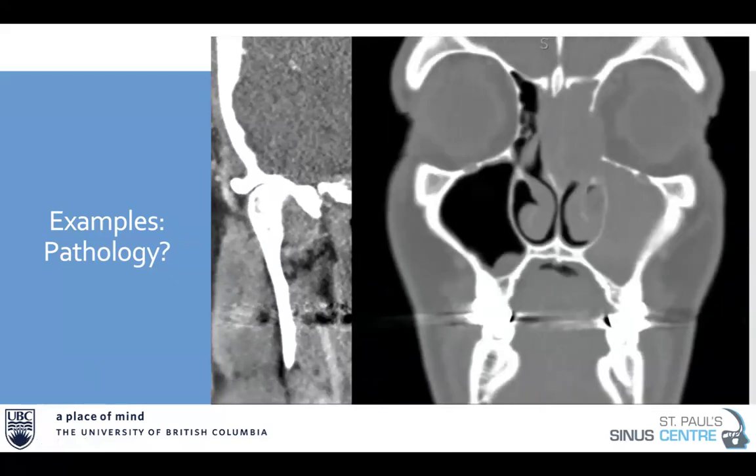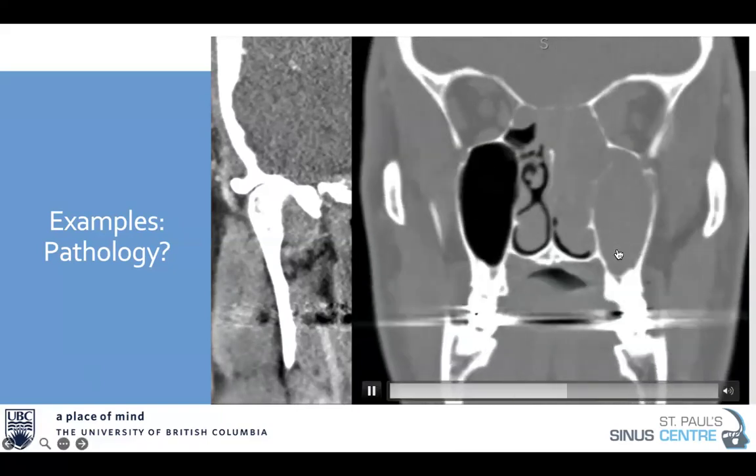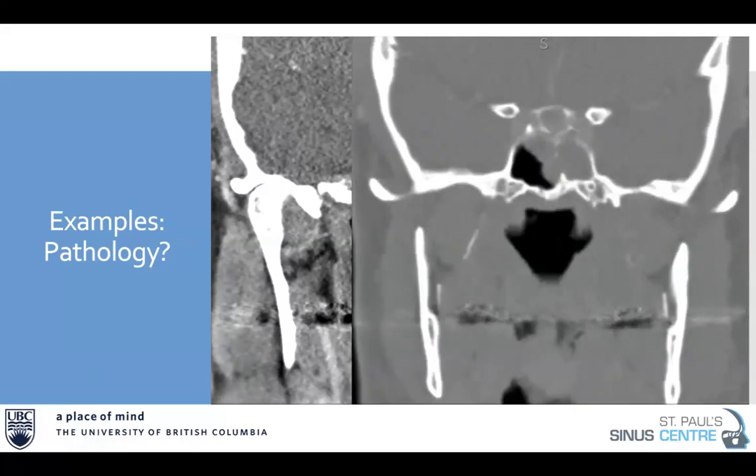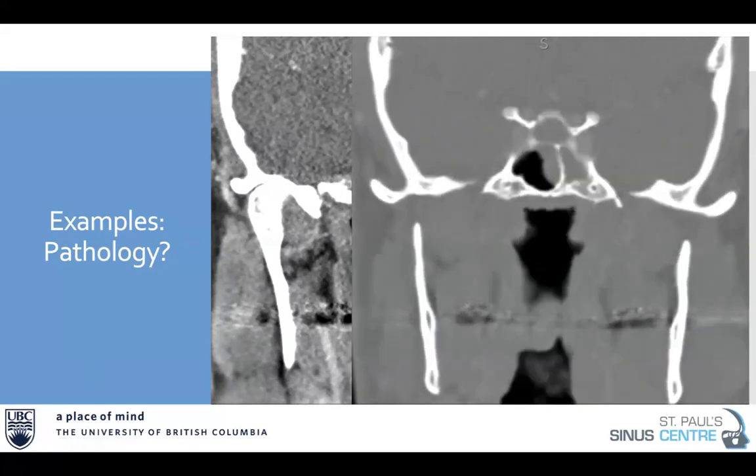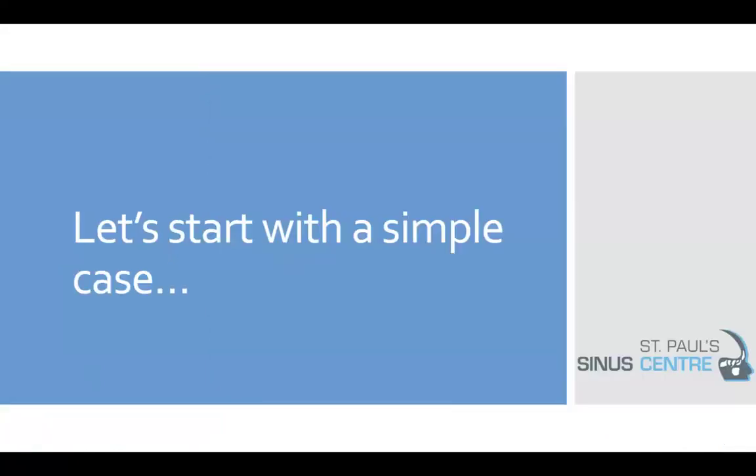So when you're assessing a tumor that might have invaded into adjacent structures, you might need another window width or window level. So, be careful when you're choosing your window width and window levels because you want to get the best ones for what you're doing. Okay, so now time for you guys to go to work.